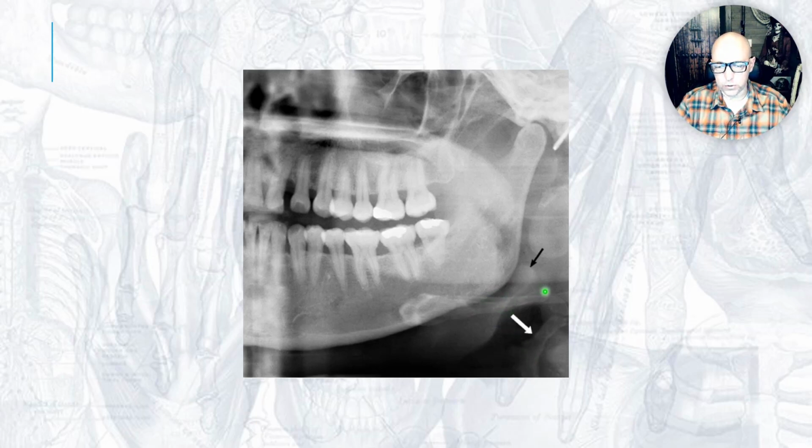If I look a little closer at this hyoid bone, the greater cornu, I see a little something projecting and stretched across. What gets stretched out horizontally? Ghost images. And so what this does is you have the real image of the hyoid bone. So this is the left side because it's the real image. It's properly proportioned. It's not stretched out horizontally. And then the ghost image of the right side gets projected way out to the side because it's stretched horizontally.